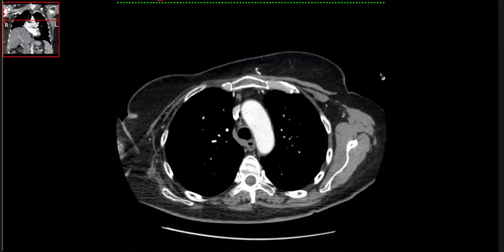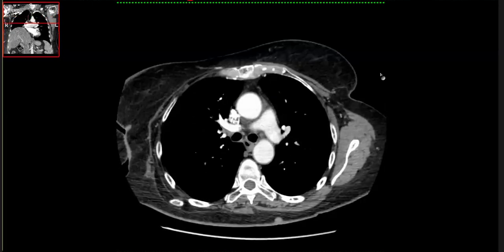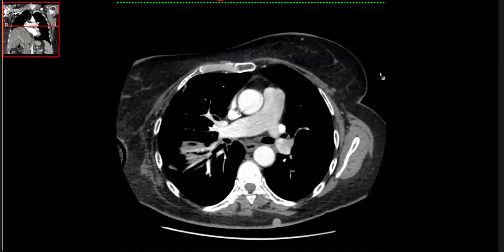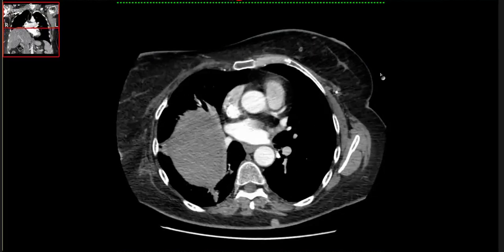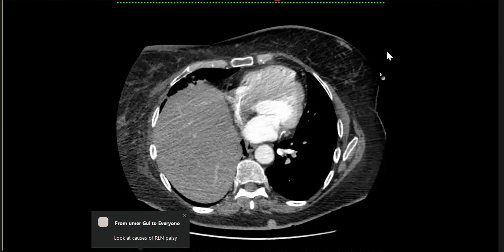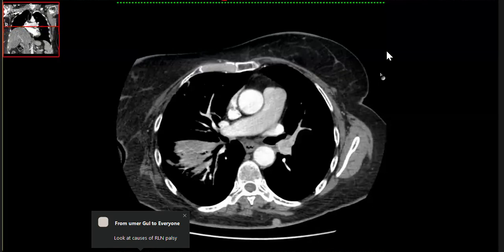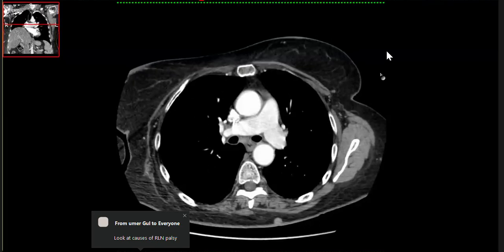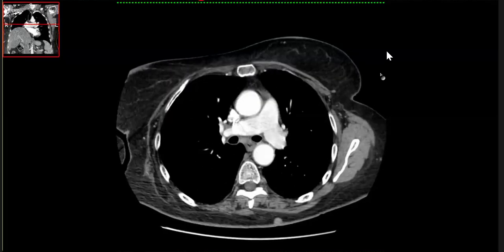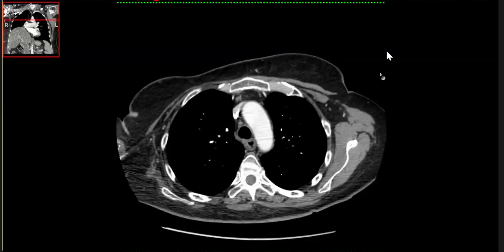Any signs there of pulmonary deposit? Okay. I'm also trying to check. I would be concerned to check for any pulmonary embolism. I'm trying to check through the vessels. I can't really catch any filling defects in the pulmonary vessels. And the aorta, there doesn't seem any, and the main branches.